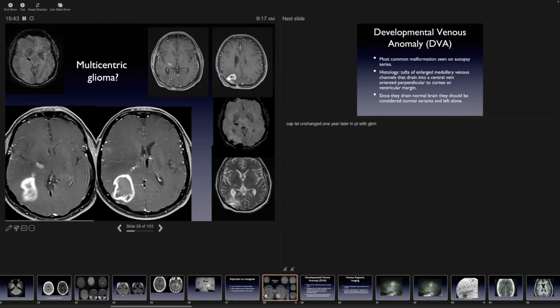So this is a patient with two different diseases manifesting in the same patient, a capillary telangiectasia and a primary brain tumor. But it's important to recognize in this case, because if you have an aggressive surgeon who for whatever reason considers going after that second enhancing lesion, this would of course entail much greater morbidity for the patient.